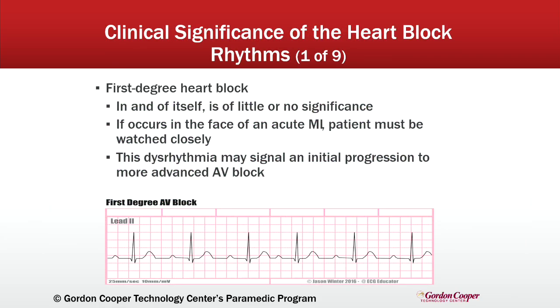So, first degree heart block, let's talk about the clinical significance. Like we've talked about, by itself it isn't typically a huge concern. It's essentially a delay in the electrical conduction between the atria and the ventricles. It doesn't usually cause immediate issues. However, if this block occurs during or after an MI, it's important to keep a close eye on the patient.